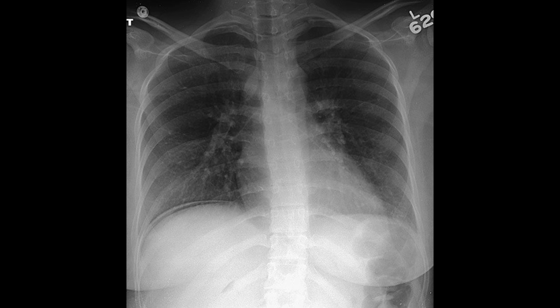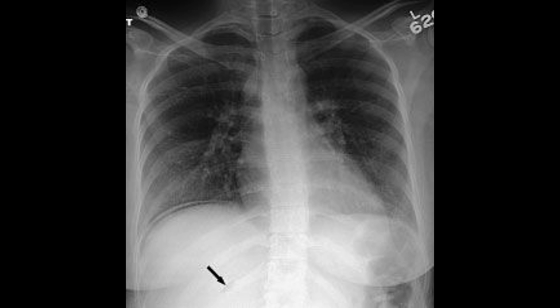This is a chest radiograph of a young woman presenting with sudden onset of chest and shoulder pain. The frontal radiograph shows a crescentic lucency beneath the right hemidiaphragm, representing free intraperitoneal gas. Another lucency is seen above the right kidney, within the hepatorenal fossa. This appearance is referred to as the Doge's cap sign, as it resembles the pointed cap worn by the historical leaders of Venice. These findings are characteristic of pneumoperitoneum, in this case secondary to a perforated peptic ulcer.